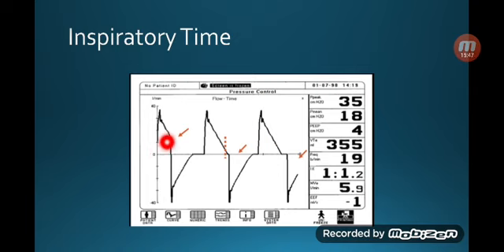So if you look here, again, this seems like a pressure target mode. The inspiratory flow curve is interrupted, taken down really quickly with the expiratory phase before going back smoothly to the zero line. While here it goes back to the zero line, but it doesn't keep the pressure for long enough.